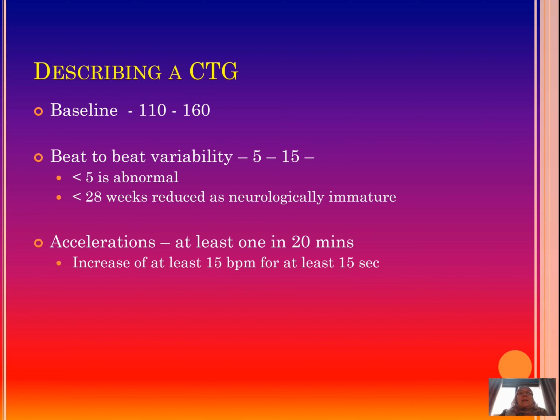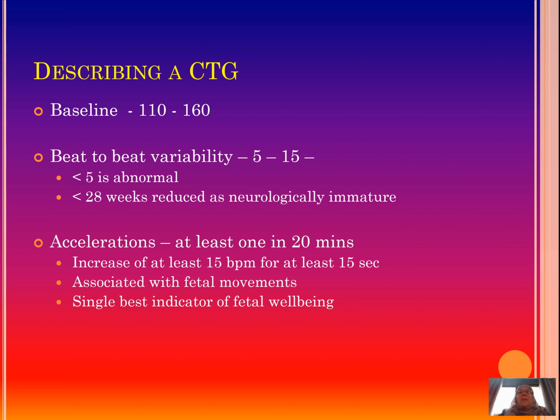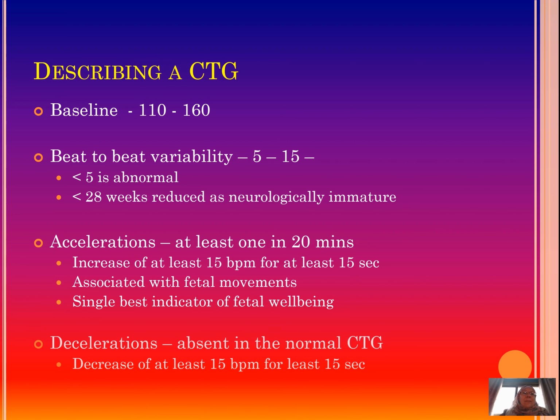Accelerations, you should see at least 1 in 20 minutes. This is an increase of at least 15 beats per minute for at least 15 seconds in the CTG monitoring. And it is usually associated with fetal movements, and it is the single best indicator for fetal well-being. So if you see an acceleration on the CTG, this is very reassuring.